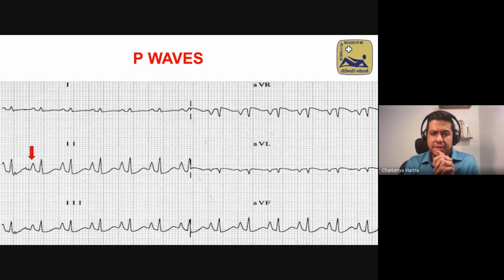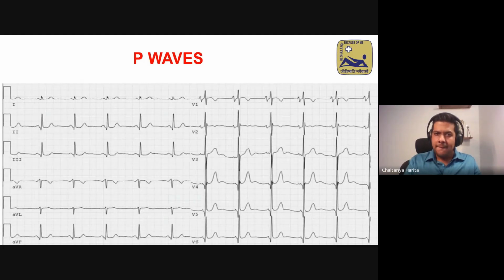Now, what is right atrial enlargement due to? Tricuspid stenosis, Epstein's anomaly, anything that's causing a problem with the right atrium, causing it to enlarge. This is another ECG. The calibration here is normal, 1 wide, 2 wide. Sorry, 1 wide, 2 height.